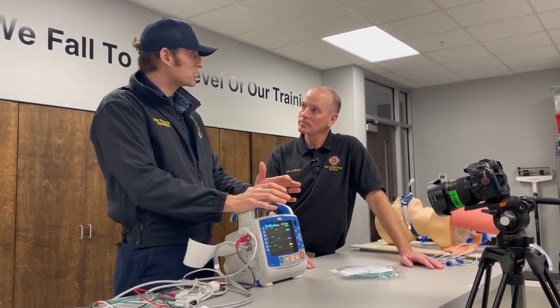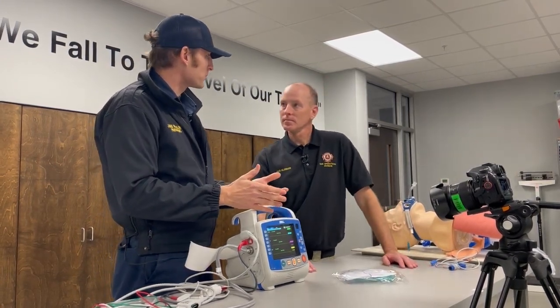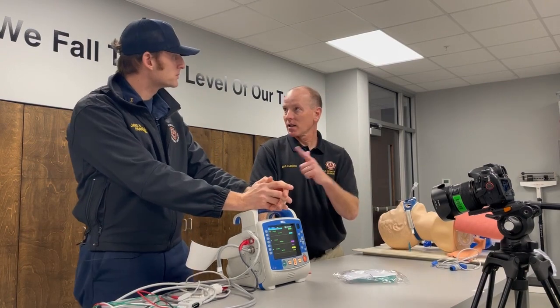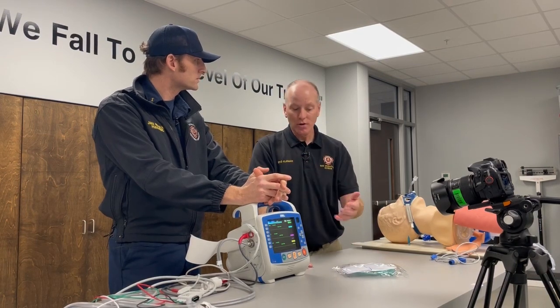So before we really get into the world of capnography and how to use it on this monitor, let's talk about just the general why and what we're looking at. And when we talk about capnography end tidal, what's the numbers? Why is it relevant? The state of Georgia put out a fantastic class for end tidal CO2 that I think Larry's trying to make everybody in the department go through. But to answer your question, 35 to 45.